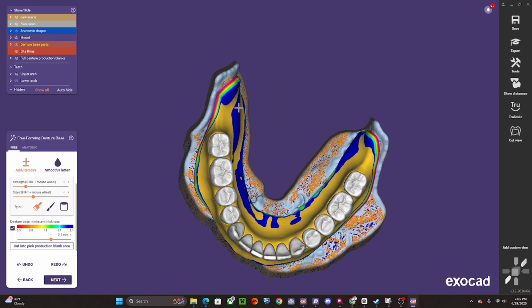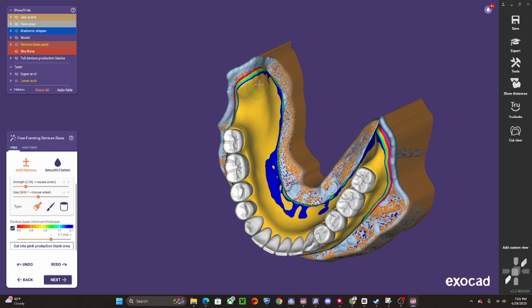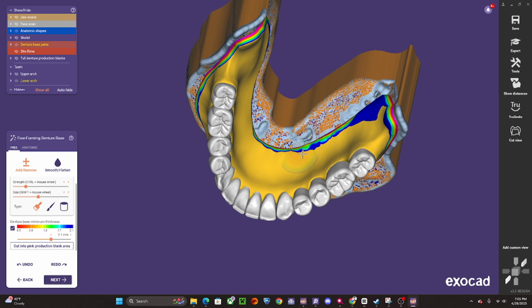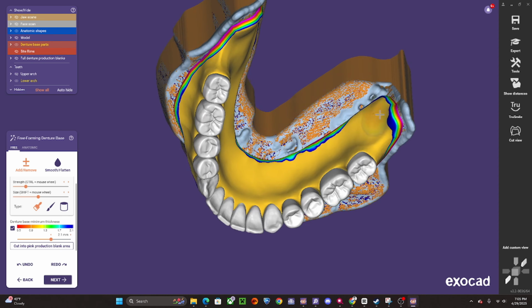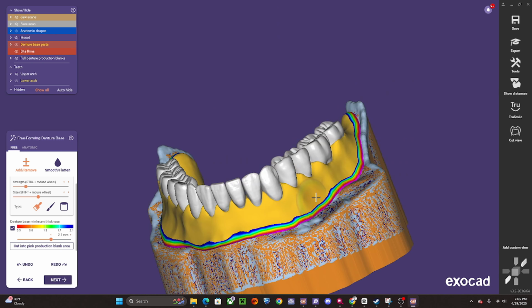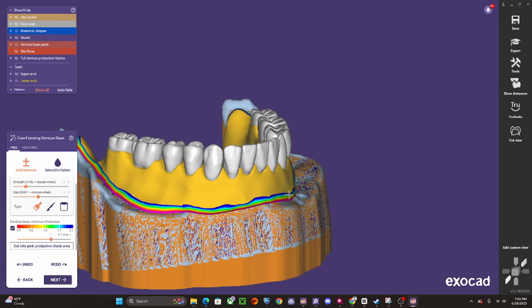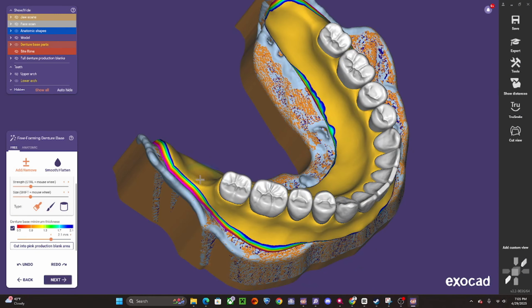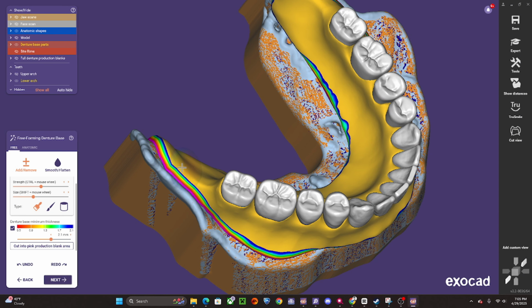That seemed to be my checkpoints when designing. Is check thicknesses, check border thicknesses, check ribbon, festoon, check ribbon. Checking ribbon and festooning kind of falls under one similar category.